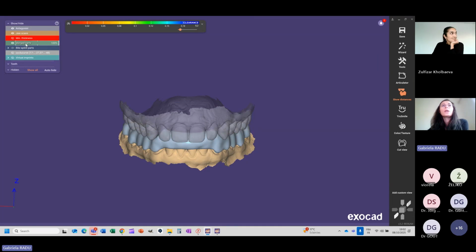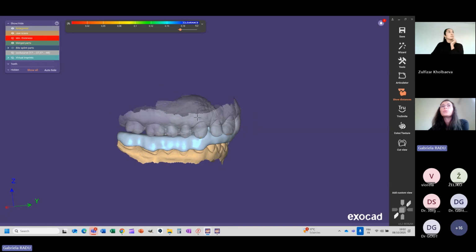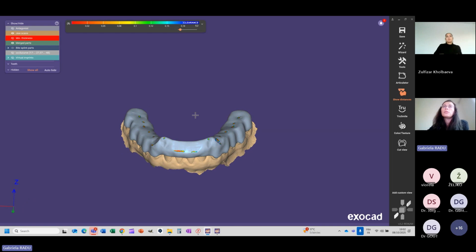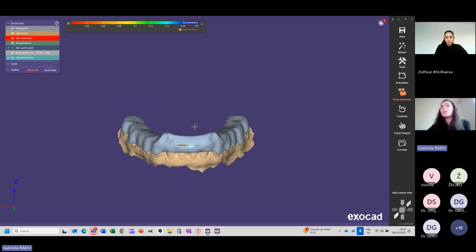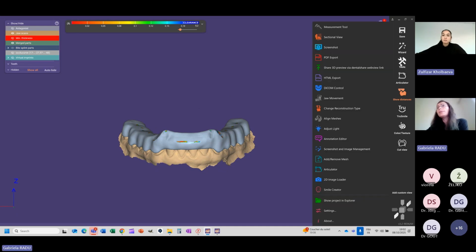This was a case where a flat splint was made on the posterior with anterior guidance. It is a great way to check a new mandibular position, to test drive the anterior guidance that we would like to input in this treatment plan, and to introduce your patient to get accustomed to it. So, like I said, we will use the data that we get from Sphere.